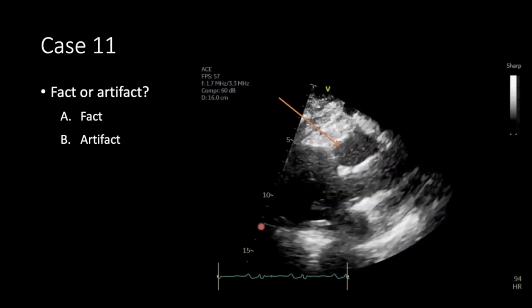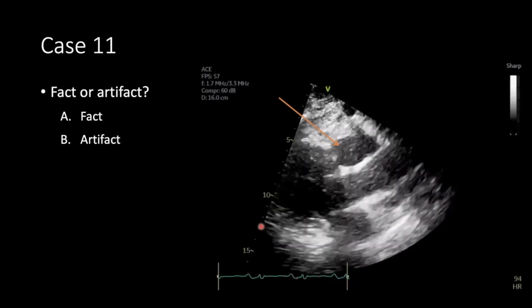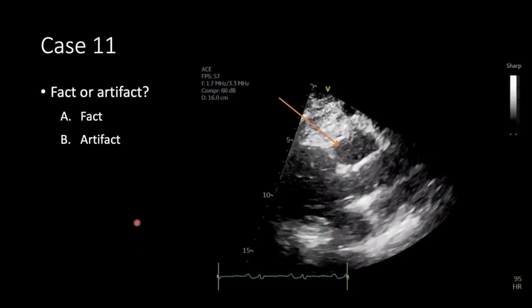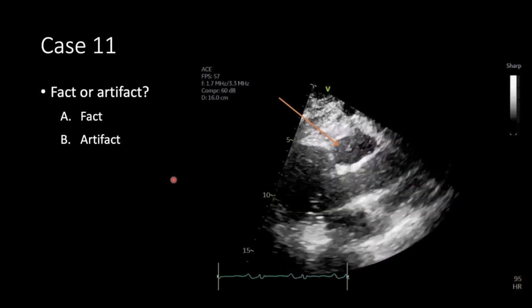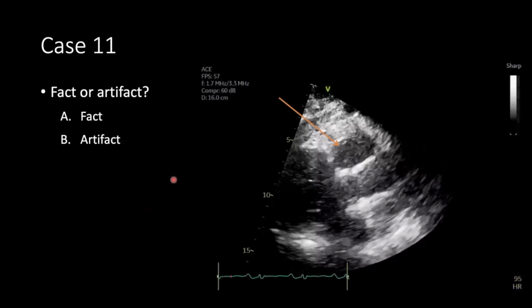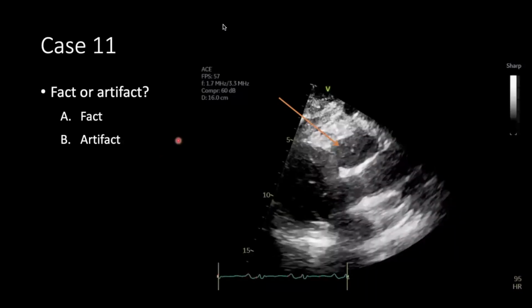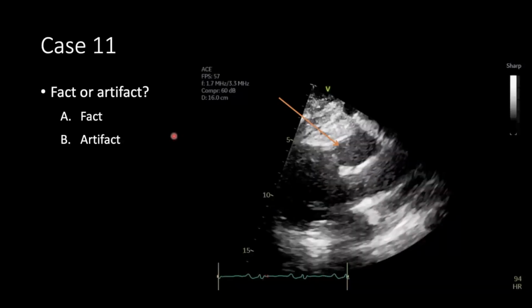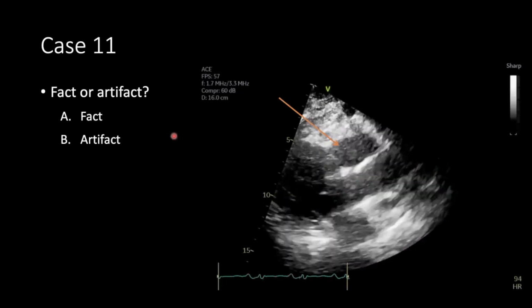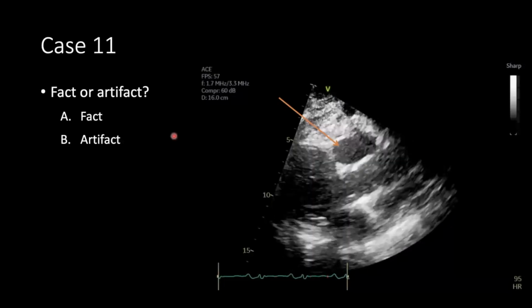So this is how well this one projects. It's quite grainy, but the sun just came out. I might skip this example just to move on to some. No, because there are some interesting ones. Okay, that's fine. People started answering already. People think it's a fact. Some people think it's an artifact. About the same here. Everyone thinks that's most likely a real finding there at the top. I don't know if you can see it at the very back. It is quite grainy. It is a bit bright. No, you can see it.